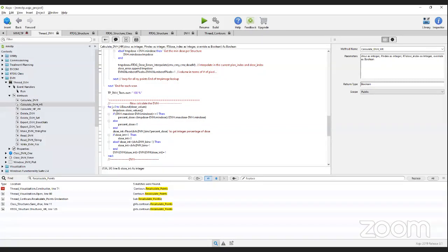No, let me just, so when we look at a DVH, oh, right, sorry. It was right here. So you have this DVH bins. So there's actually only 50 bins for these calculations, but the user can enter 100 here or 200. And all this is going to do is give you more resolution in your histogram, but not more resolution in the calculation. Like the calculation is based on the geometrical points and their distance between each other.